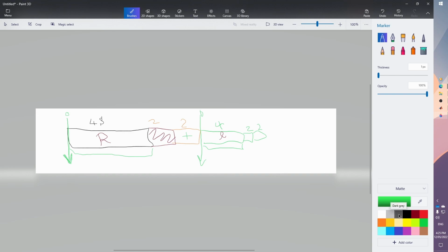So we are trying to see whether the signals of the right hand look like this and the left hand look different, like this, so that we can later look at the differences between the signals or do some fancy analysis and some machine learning, training and testing, to pick up the differences between right hand and left hand imagination, or whatever we can do with this.